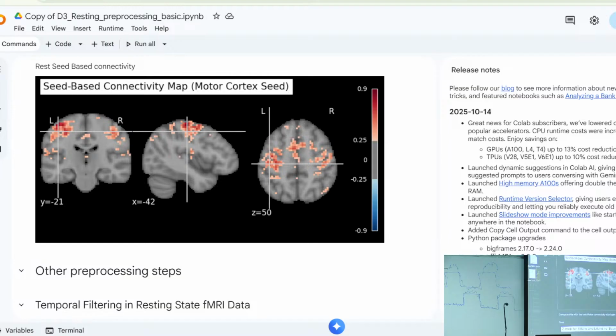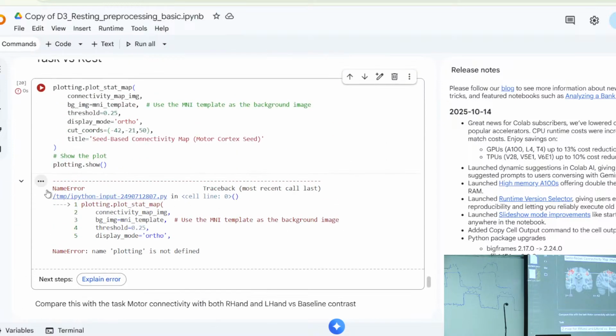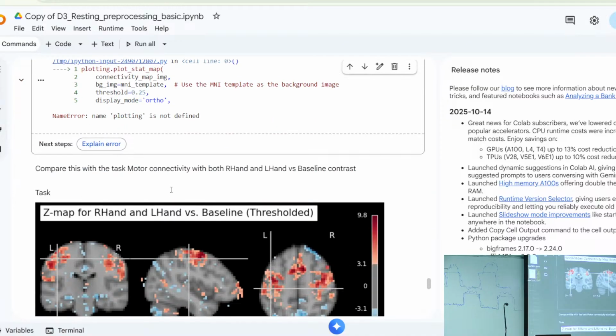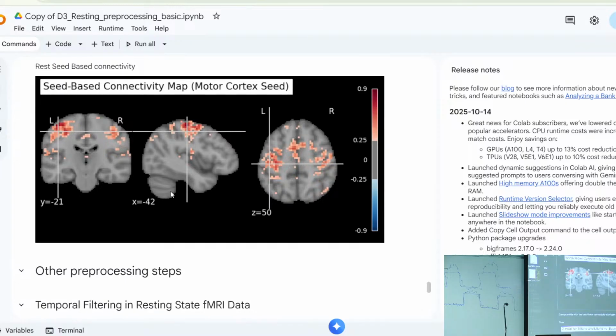That is generally on the, that's like ventricles. I think it is okay because between the skull and the brain there is CSF, right? And so that is what it is. So if we cannot easily see the contrast, but that is what it is. Okay, good. Change the threshold.